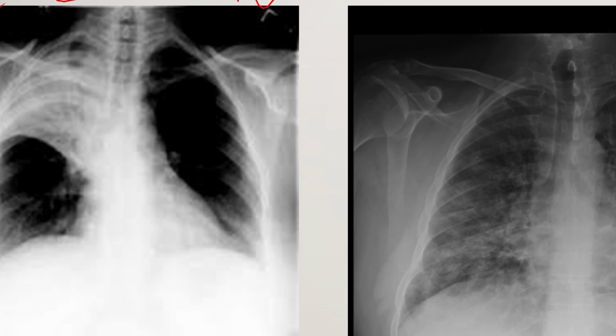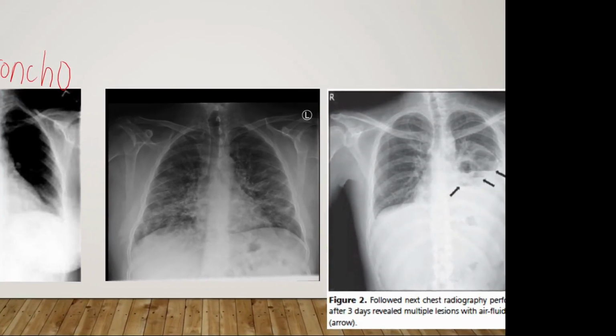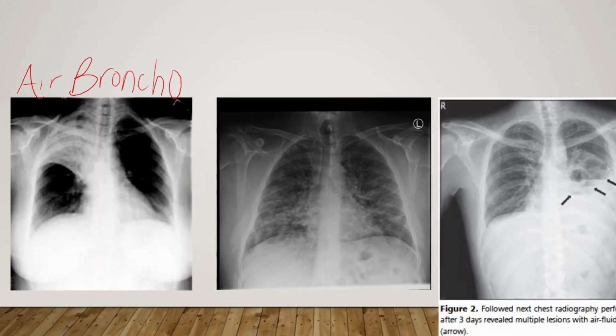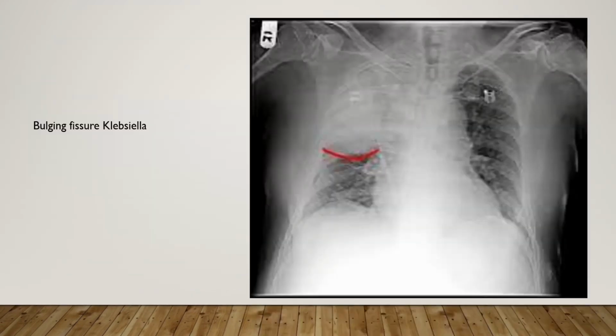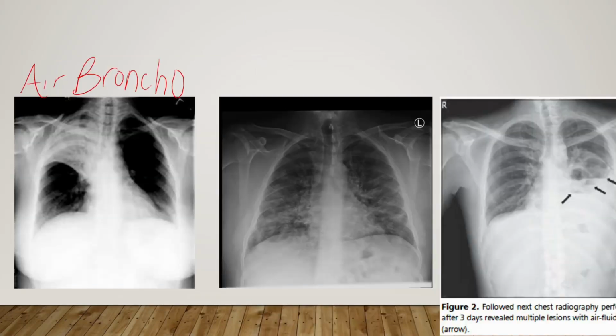In this picture, it does seem to be lobar pneumonia, which throws my theory out the window. But yeah, if it is lobar pneumonia, then fair enough. But basically, as you can see, wait, is that? No, I don't think so. Let me have a quick check. No. You know what? Let's just keep that off the table.